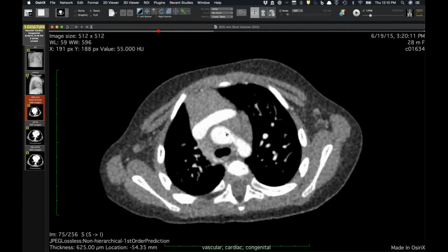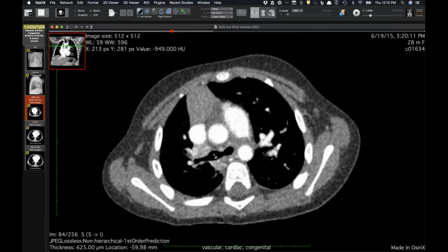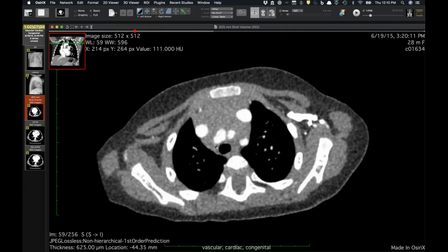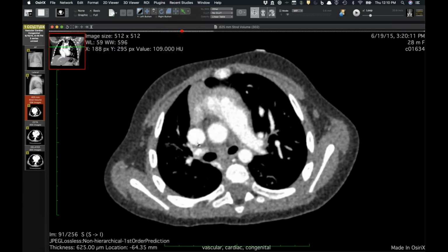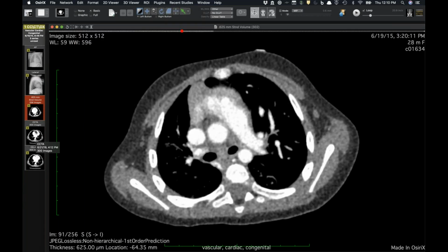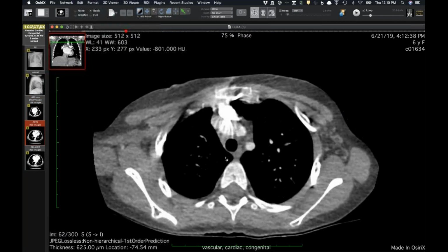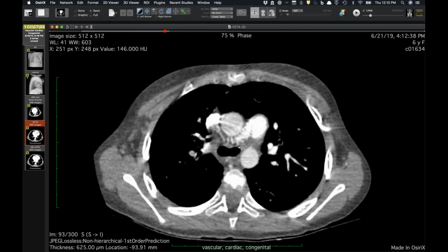And so the question that I had was, is this probably the remnant of the ligamentum arteriosum, or it is the ligamentum arteriosum, the remnant of the ductus arteriosus that formed the proximal portion of this pulmonary artery? And for whatever reason in this patient, I think probably because it was diagnosed early, they actually went in and repaired this, and they created a new right pulmonary artery.